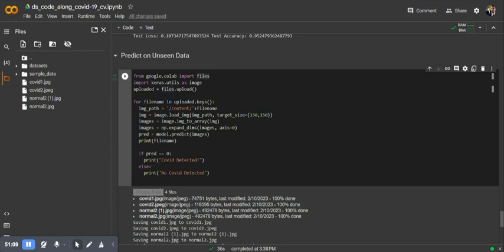It's taken just over an hour. So we can now potentially put this in some sort of app online through Streamlit or Flask and put it to production, and let people use it and let people experiment with it as well.